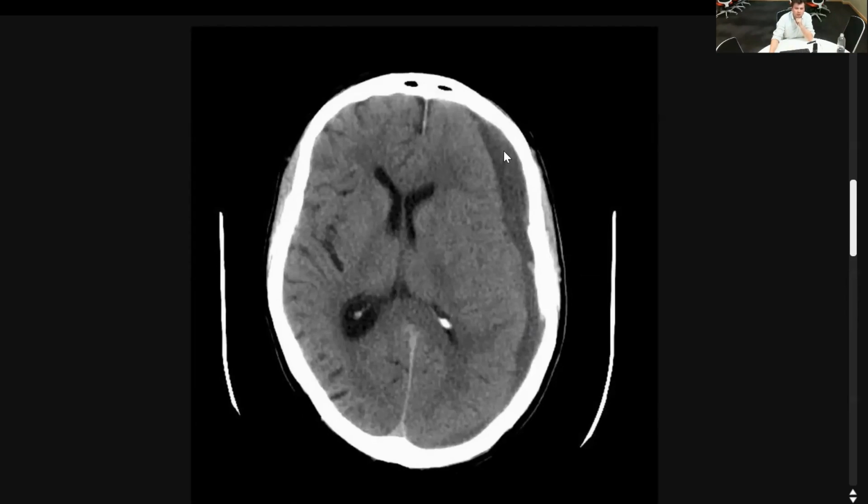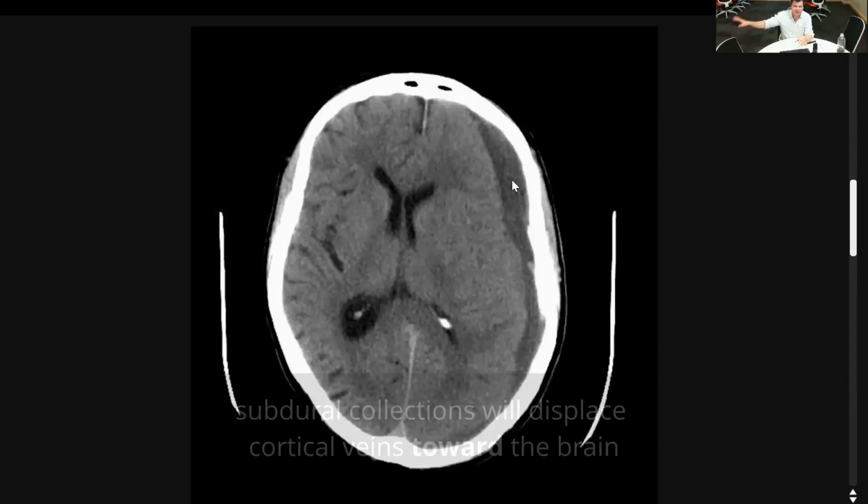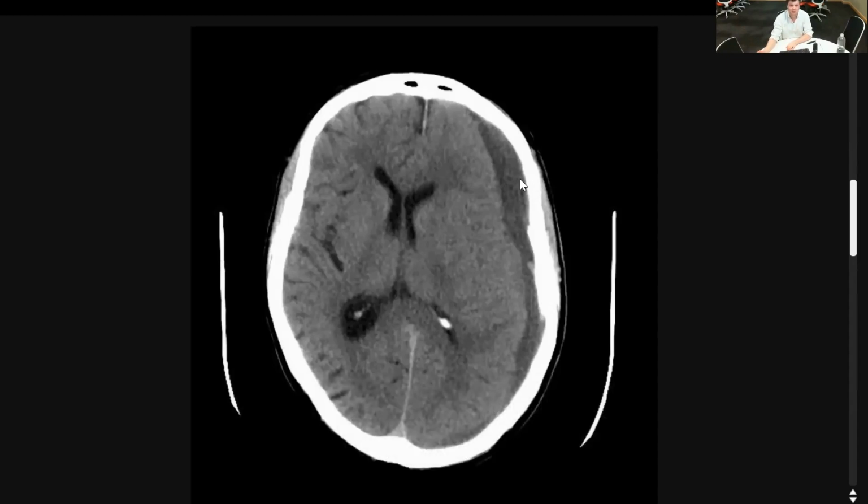So they can either be very old resolved hematomas, or they can be hygromas from other reasons. If you're needing to really pick apart a hygroma or a hematoma, it's something which happened ages ago anyway, isn't an acute finding. MR can help, but it's not going to be an emergency thing. So don't worry about calling it a hygroma or an old hematoma on call. It's the acute stuff you want to be worrying about.